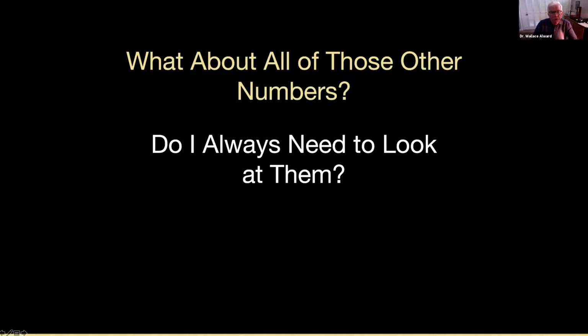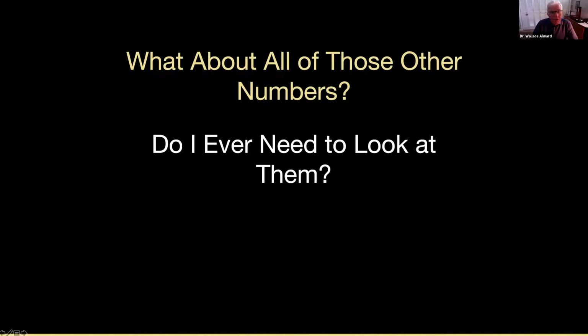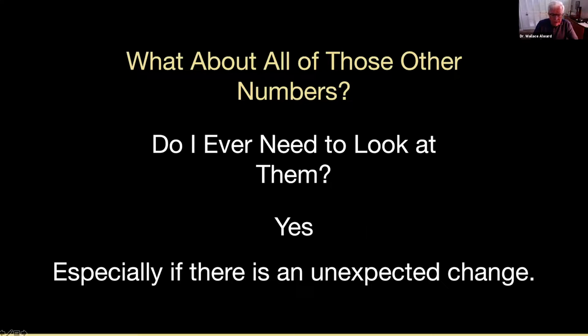But there are a lot of numbers on this printout. Do you always need to look at them? The answer to that is no. But do you ever need to look at them? The answer to that is yes. Particularly if there's been an unexpected change in someone's visual field, then you need to start looking at things that you don't normally look at. That's sort of where this talk is going.